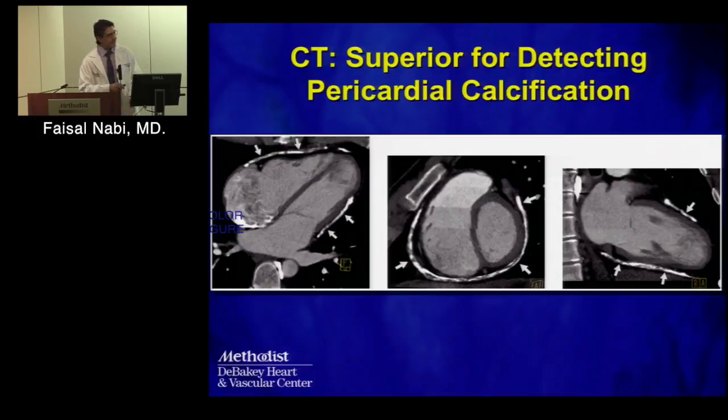I think this is a nice image to highlight a very important statement Gopi made: you can now imagine this heart sitting in this solid, rigid structure. You can almost imagine that there is no room to expand in a pericardium such as this, and that filling of one structure will occur at the expense of the other.